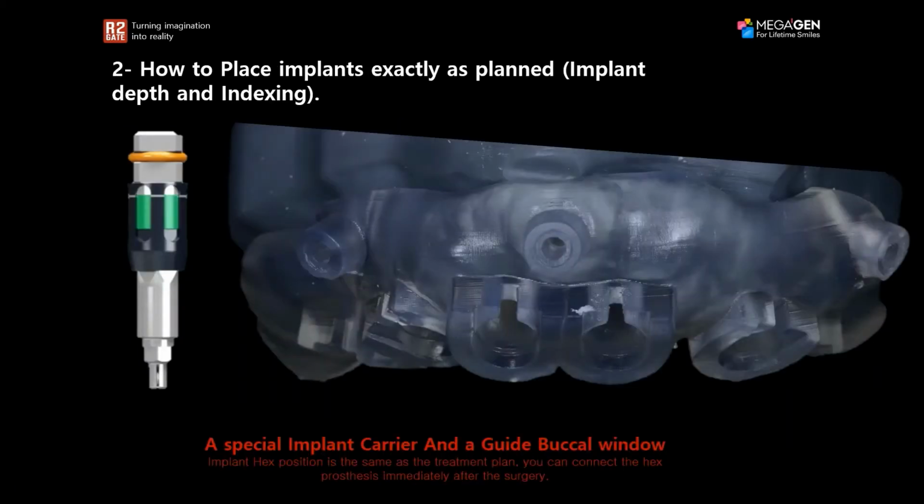Now, challenge number two would be, how do we place implants exactly as planned in terms of the implant depth and the indexing? And I'll tell you how we could do that through a special implant carrier and a special window in the surgical guide design.